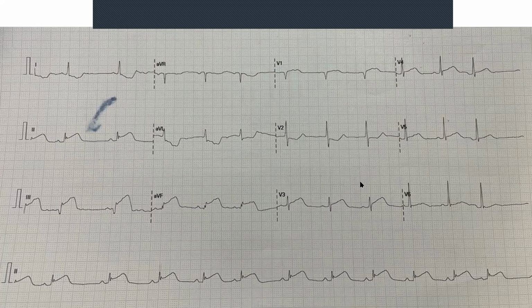What's going on? It's possible. But remember, V1 and V2 work as a couple. Right? And what do we see in V2? That's a neutral line. Below, isn't it? So you've got an ST depression. Okay. So we'll get to why it looks like that in a little while. But here it's already showing a possible reciprocal change.